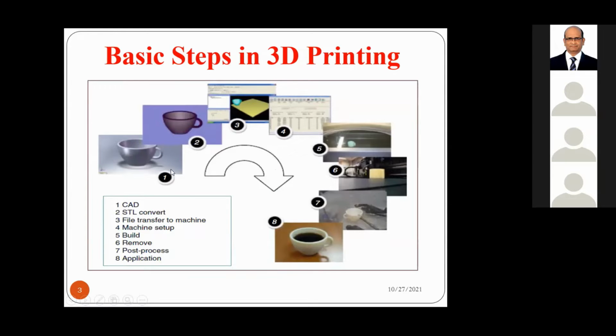First, we take a CAD model. This is how we develop a CAD model, the computer design. Nowadays, many software packages are available. From the software we develop the CAD, and that CAD model we convert into an STL file.